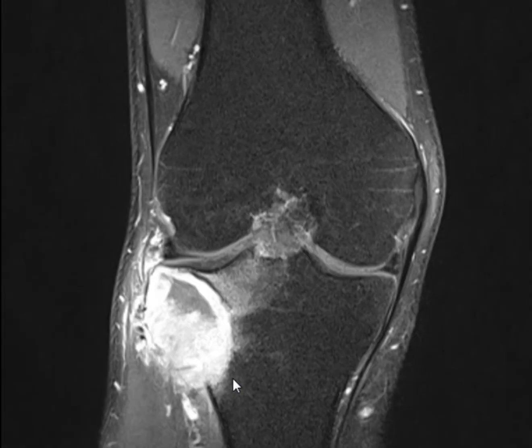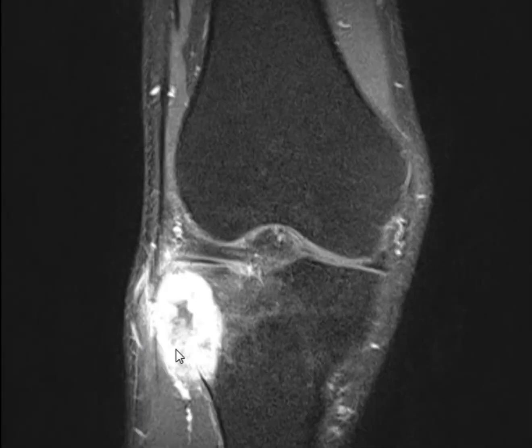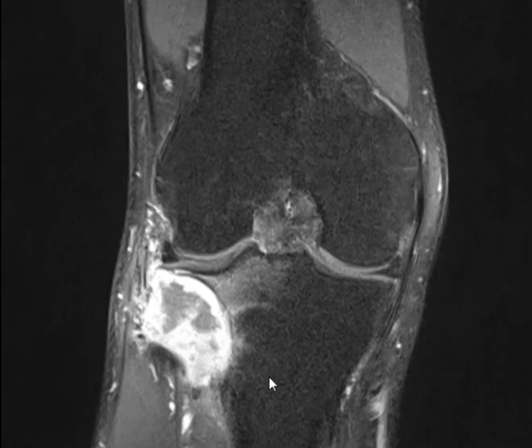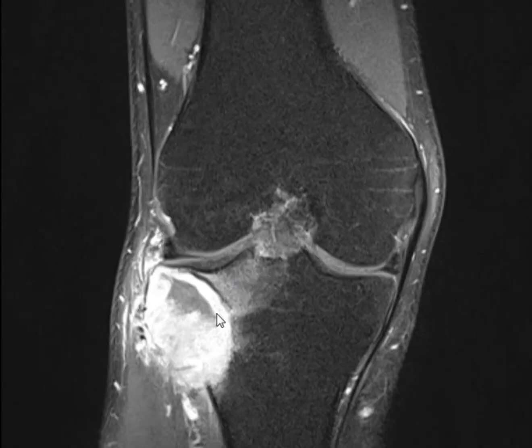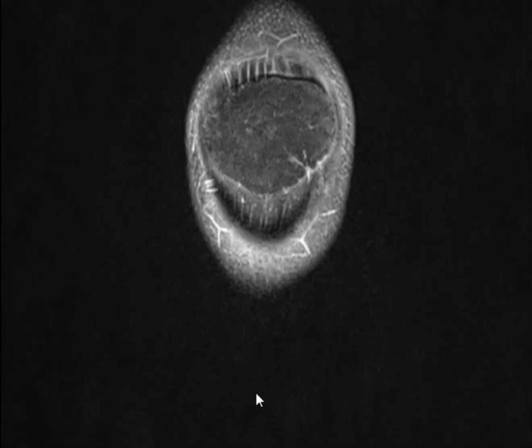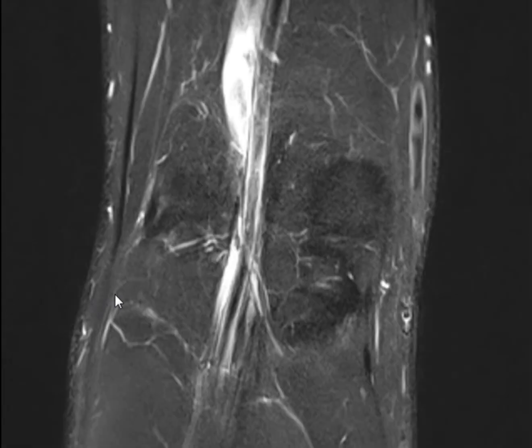It's of mixed intensity. And is it of mixed intensity? What is this example? What's the sequence? It's contrast. So it's enhancing. What's the sequence? T1, T2, proton density. T1. So it's T1 fat saturated. So you skipped all the T1 and T2 and fat saturated and went directly to the contrast, which is a fatal mistake in the exam.